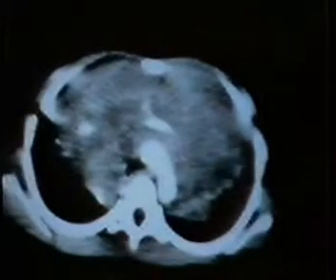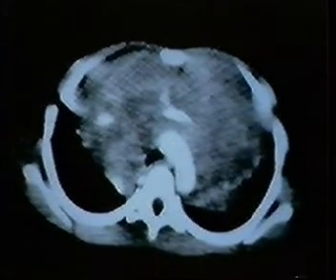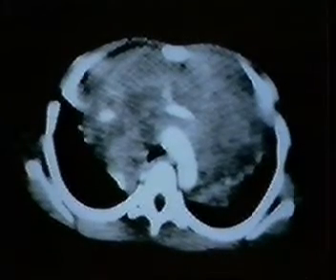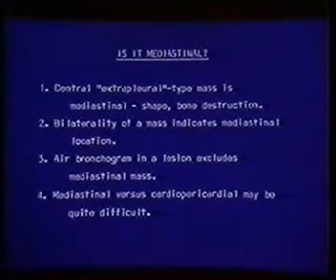particularly when you look at something like this. A little bit hard to appreciate where it is at first, and a very intimidating case to put up, but when you start to think about it, an abnormality that's sticking that far out into the right chest and that far out in the left chest is probably originating from the mediastinum and pushing out on both sides. And in fact, on the CT scan of this case, you can see this is just a huge mediastinal mass in a patient with nodular sclerosing Hodgkin disease. So the bilaterality may well be indicative of a mediastinal location.